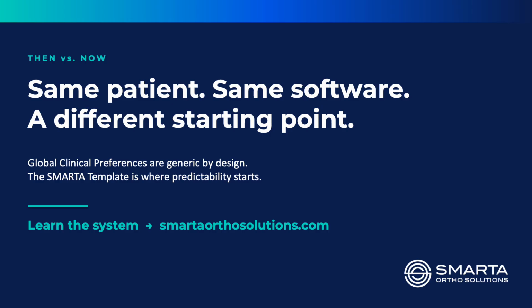So that's the same patient, the same software, but two starting points. As the SMARTA template was built, the question I asked on every case was, how close did each initial ClinCheck plan get to the plan that I actually wanted to approve? You saw the answer on this case. It's still my decision in 3D controls, and it always will be, whether or not we're going to do a couple of customizations for rotations. But far more of this plan was already built in.